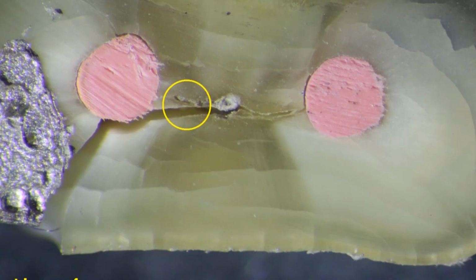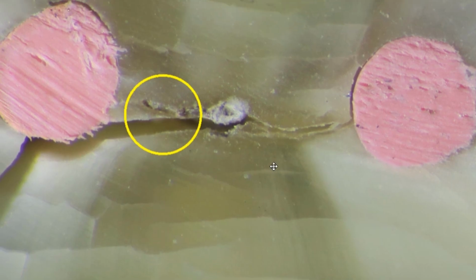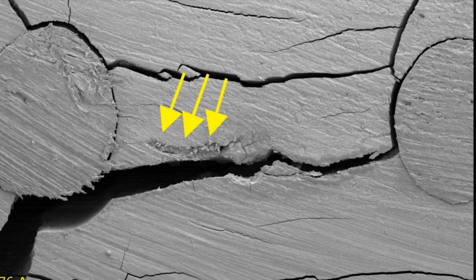This is the fourth section. Then we turned it over and looked at the opposite side as well, and you see pretty much the same thing. We'll go into that little finger area that looks like it's been eaten away or resorbed.